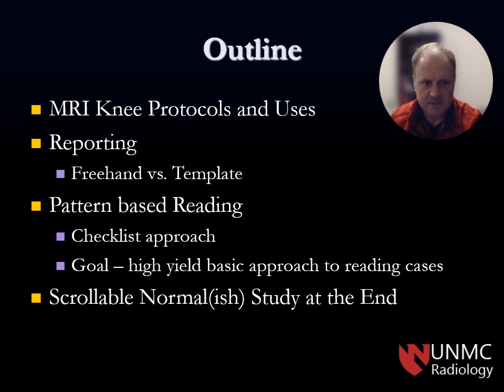I'll show you what checklist document I use when I read MRI of the knee, and I will try to make that document available to you as needed, because I think it's very helpful to have in front of you if you are going to start reading cases. The goal of this is basically just to have a high-yield basic approach to reading cases.